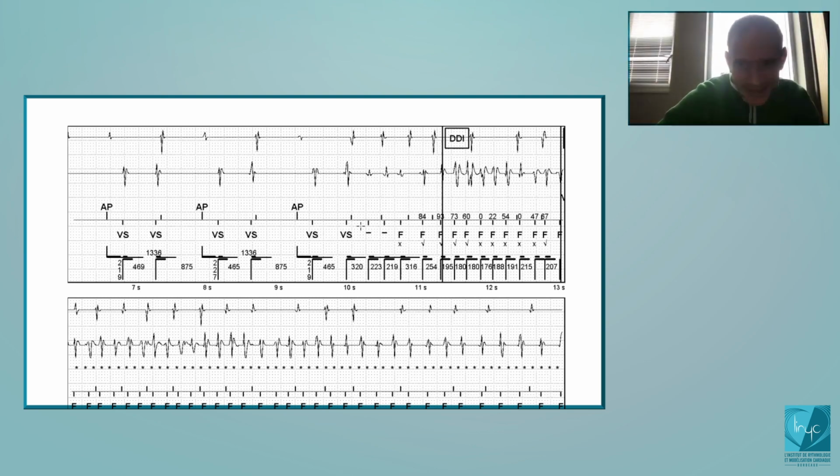Here, as you said, that's completely different, since all the time you classify the current interval compared to the mean value of the last four. So this one, this one, this one, and this one. And if, like in this example, you see there is a discordance between the current interval and the last four, then you will have this sign explaining that this cycle is unclassified, or is considered as a transition.